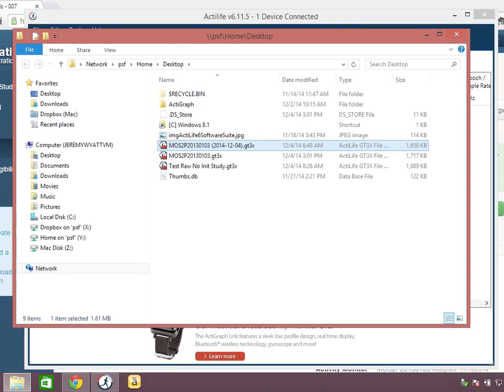Catherine and Christy both simultaneously ask if it's possible to export to SPSS or XLSX. So thank you both. And as I implied a moment ago, when we get this data into the study admin system, you will be able to export to those file formats as well. But today, you can go out from GT3X to CSV to Excel, and I think you'd have to convert for SPSS. I don't believe we have a direct export for that, but we do plan to support it. It's very popular. We do plan to support it in the study admin system very, very soon.